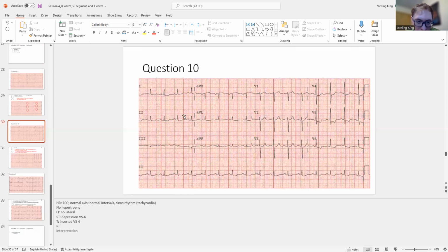Let's do Q waves inferior. Nope, nope, nope. So inferior. And then STs. Pretty flat, pretty flat. This looks like 2 boxes below that line, 2 boxes below that line, so we're good. This looks like a box and a bit. This one looks like 2 boxes straight up. This one's like 1, this one's like 2.